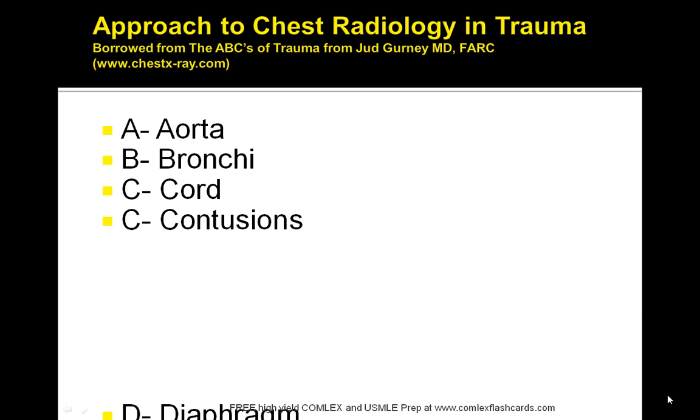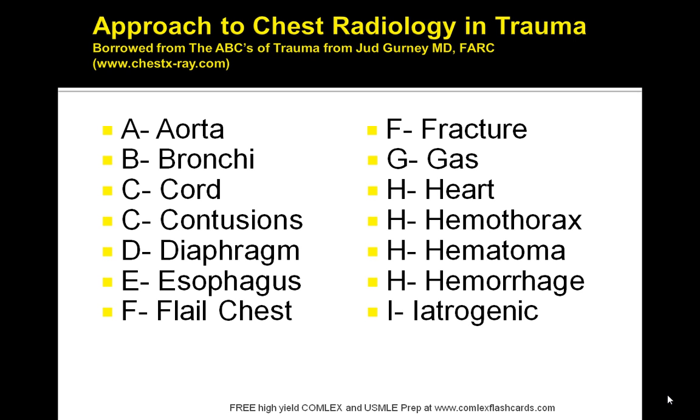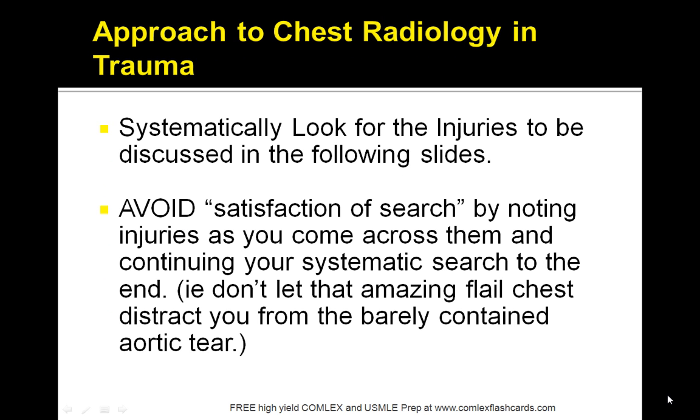Let's take a look at the approach to chest radiology in trauma. Keep in mind that it's important to develop a nice system so that you can approach chest radiographs in a systematic way. We're going to be reviewing the following factors. Also, avoid satisfaction of search, where you miss the key finding by being distracted by an obvious sign or a distractor as you're reading the chest x-ray.